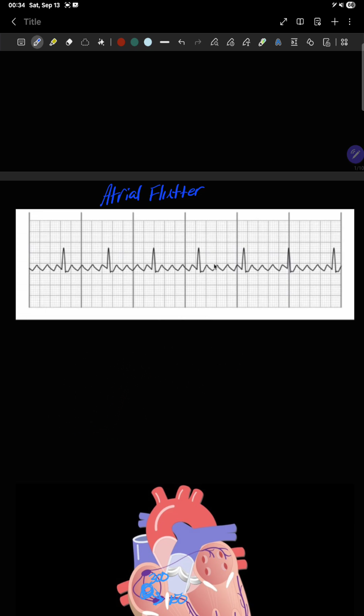This 4-to-1 right here, look at that. That's spaced. Now what if I landed right there and we have 1 F wave between the QRS? Yeah, that's what I mean of how a 1-to-1, a 2-to-1, this is just a simple way of measuring these.